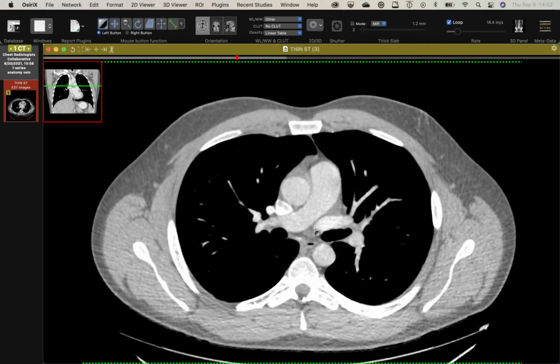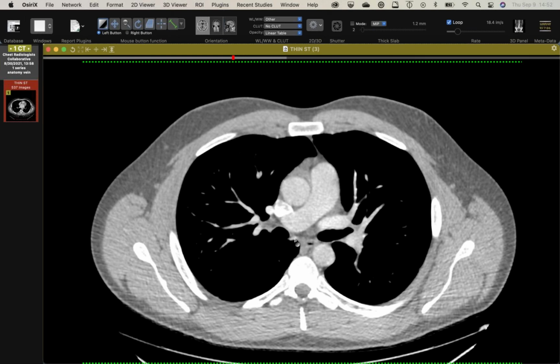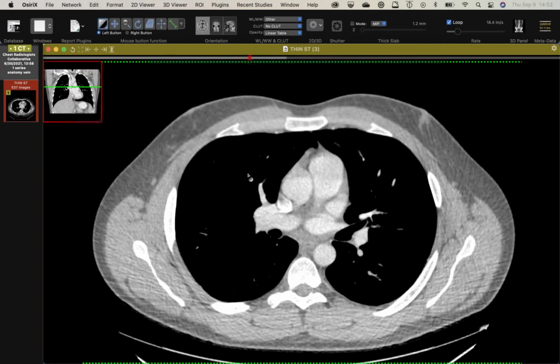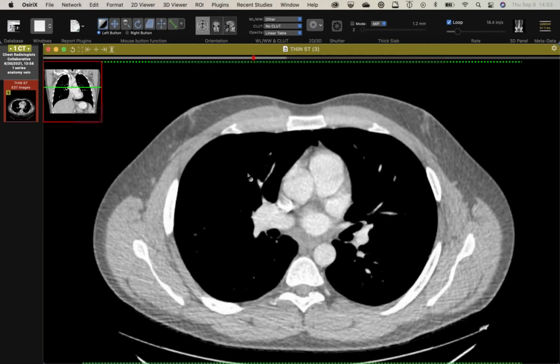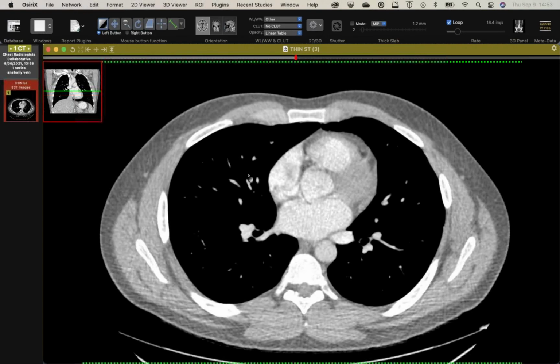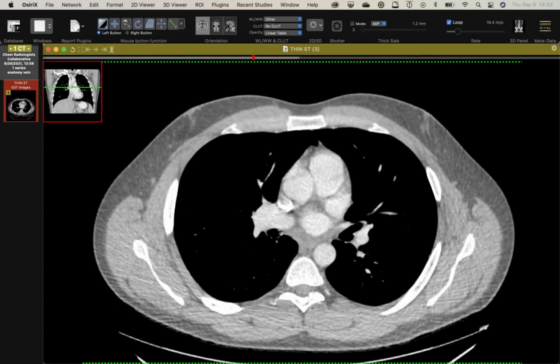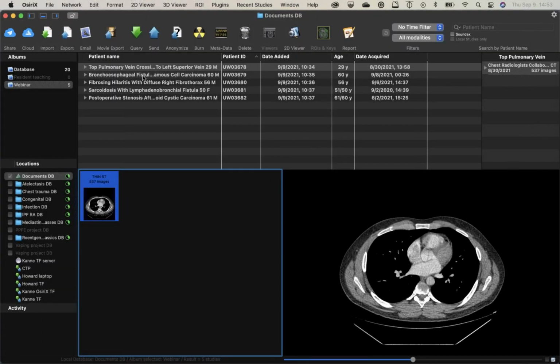It has absolutely no clinical significance, other than, I guess, if you're going to do a lobectomy, you probably want to know about it so you ligate it and don't have a little bleeder intraoperatively. There's also some other little vein right below there, going right behind the bronchus intermedius as you scroll down, right there. That's just a little branch that goes into the superior vein. I've never seen one before, at least I should never noticed one before.